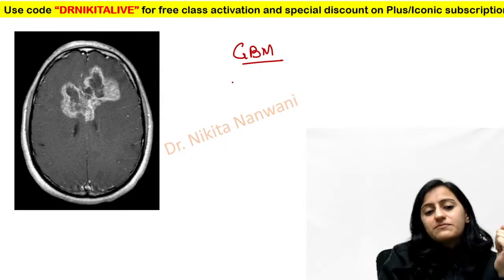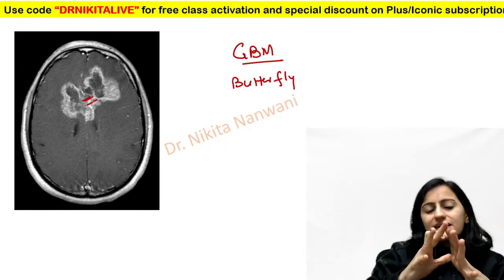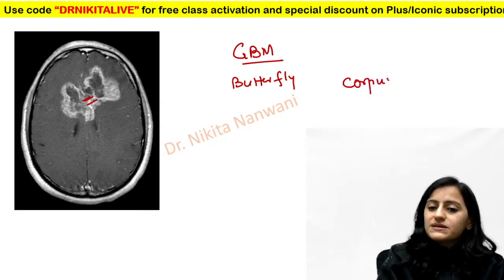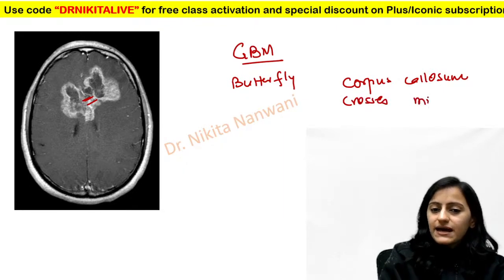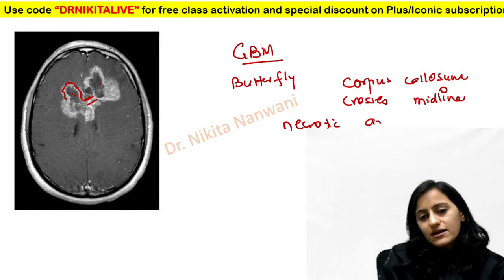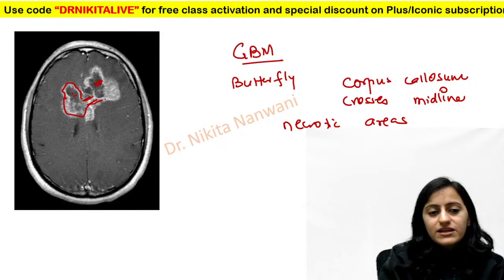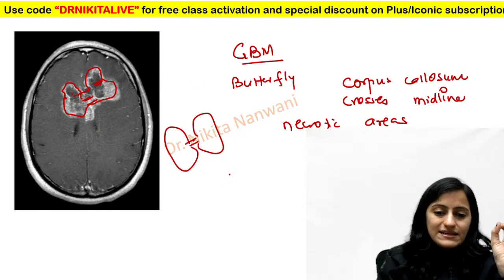And why do I call it GBM? Basically, it has this butterfly shape. You can see it is crossing the midline. It's on both sides of the midline. That means it is involving the corpus callosum, right? It involves the corpus callosum and crosses the midline. That is a GBM. And you can see these necrotic areas. GBM has necrotic areas which indicate high grade malignancy. So these are the non-enhancing necrotic areas, and this is the butterfly shape appearance. So that is GBM, a very aggressive tumor.